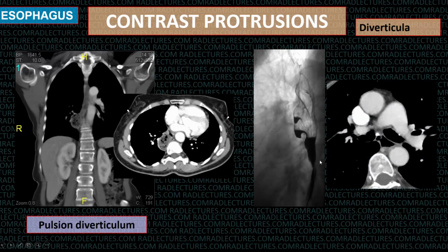And if you look at the CT scan in this patient, you find that this is the esophagus, those are the two diverticula, and there is a calcified lymph node, which is actually responsible for formation of these diverticula. They contain all layers of the wall, and therefore they do not usually contain residual contrast or food, whereas pulsion diverticula do.